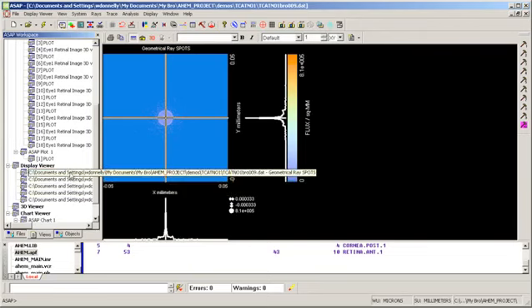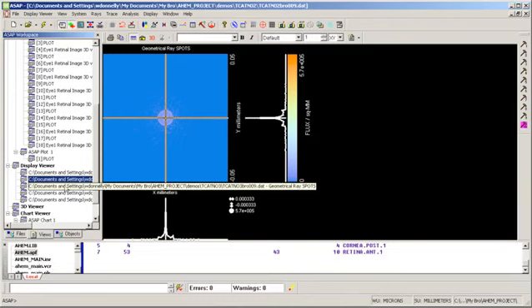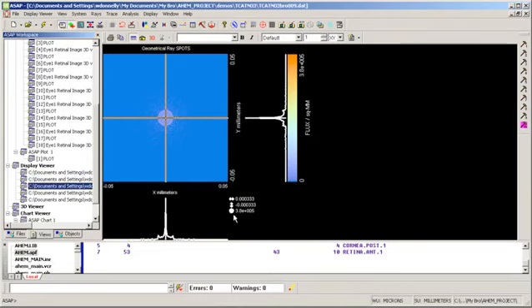And if I step through the different levels, this is the first level, and the second level, you'll see the numbers change up here as far as maximums, and over here, intensity of that point spread function. So as I increase the density, you'll see these numbers go down, relative to the density of the cataract.